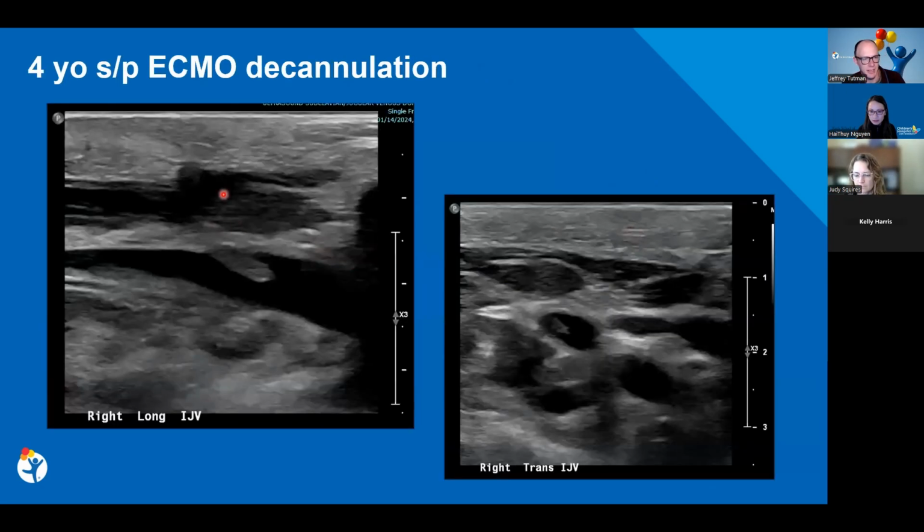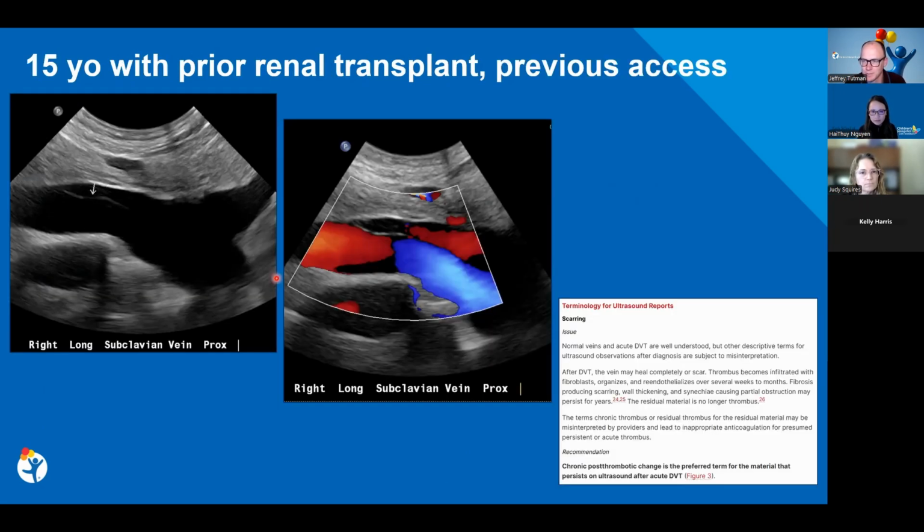And then a similar case, so this patient was known to be... Oh, Jeffrey, kind of similar to that line. Do you guys ever call fibrin sheath? And then how would you know the difference? I do when it's a linear thing clearly related to the catheter. Yeah, same. I think history is really important for those, like knowing they had a line in that location. And then if you see that kind of tubular looking thing, that's when I use the word fibrin sheath.